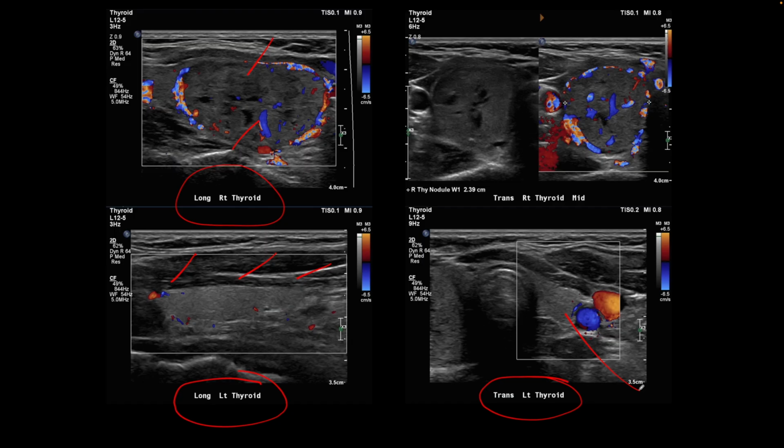We also performed an I-123 iodine uptake and scan on this patient, and this is what we found. The uptake value is elevated at around 63%. There is increased uptake in the right lobe of the thyroid, and there is no or suppressed uptake in the left lobe of the thyroid. So this patient is a good candidate for I-131 treatment. Whatever 63% of what you give orally to treat this patient in the form of I-131 will go and treat this nodule, and over a period of time, the normal uptake in the left lobe of the thyroid will come back, making this patient euthyroid.